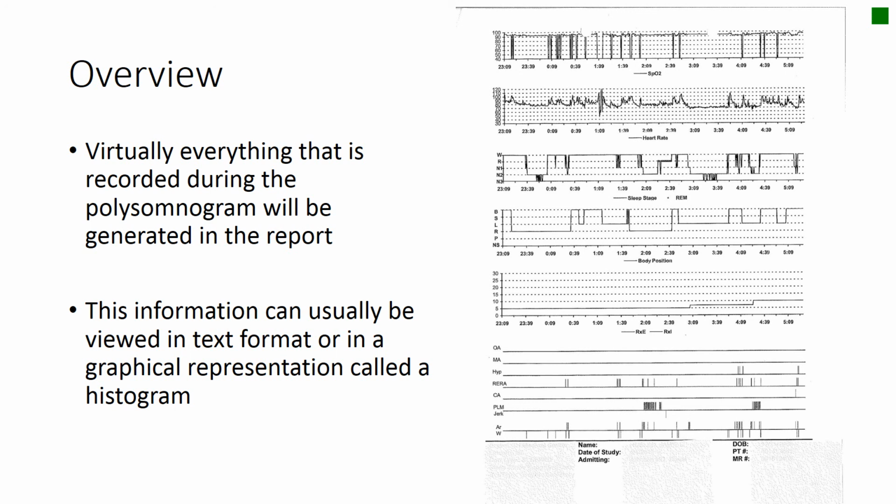And then that's really about all they got that night. Body position, so you have your abbreviations over here. S is usually supine, L is left, R is right, P is prone, or they must be using B for back on this one. Strange. Anyway, you can have a good snippet of the night for the patient on that.